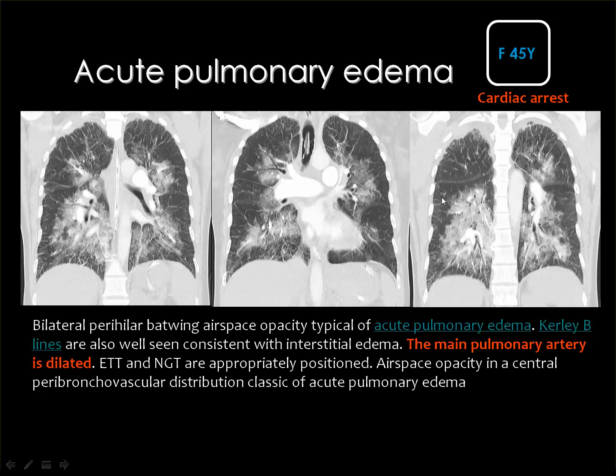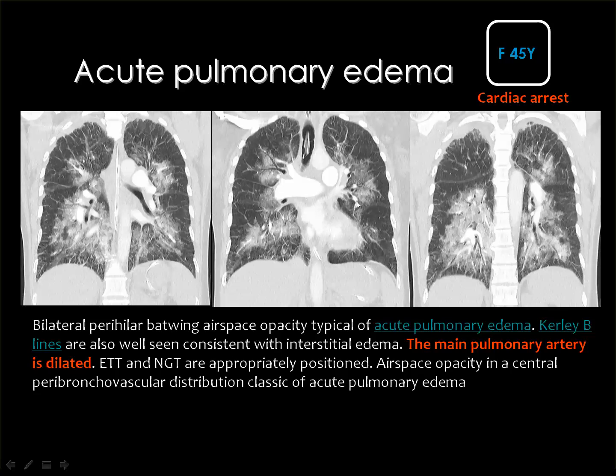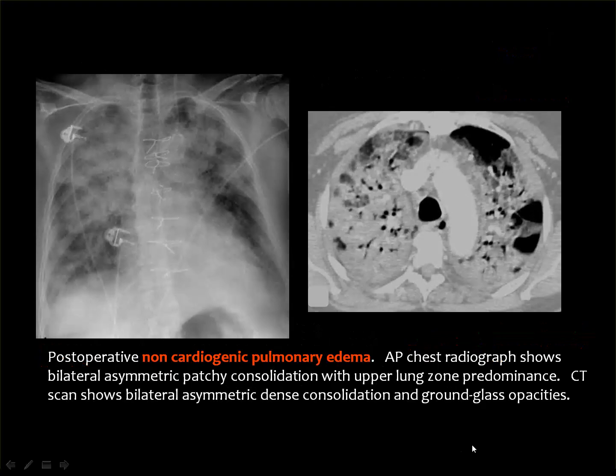And the CT scan of the same case showed extensive bilateral ground glass opacities on both sides of the lung fields, and you may identify also the septal lines. Actually, if we have the section that is passing through the pulmonary artery, we can assess this finding. But if you look here in this coronal image, you can see that the right pulmonary artery as well as the left one are dilated.